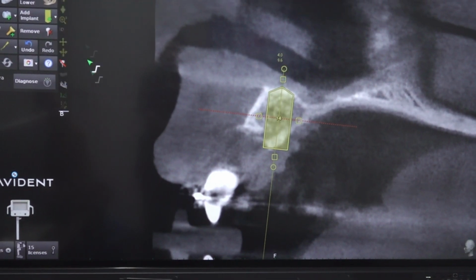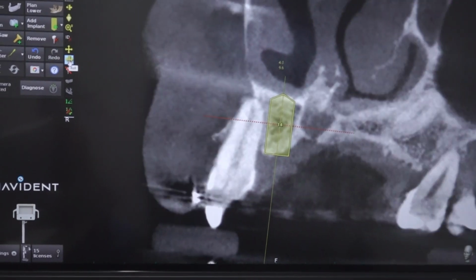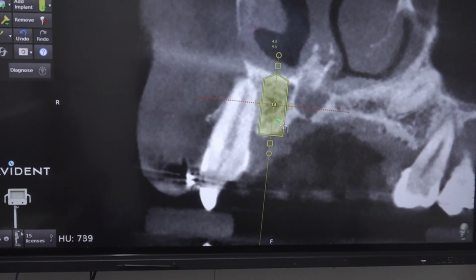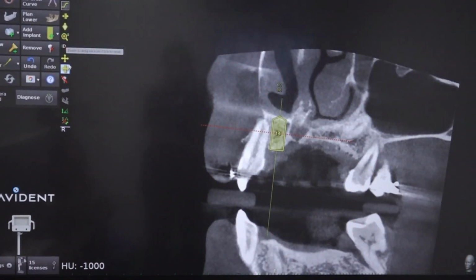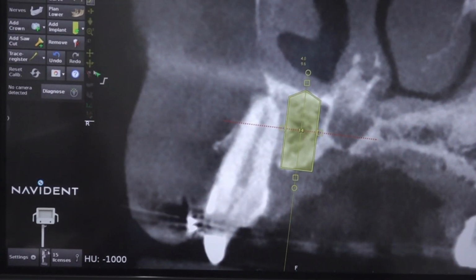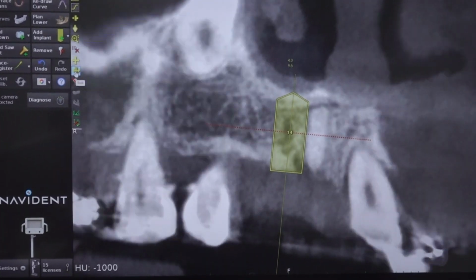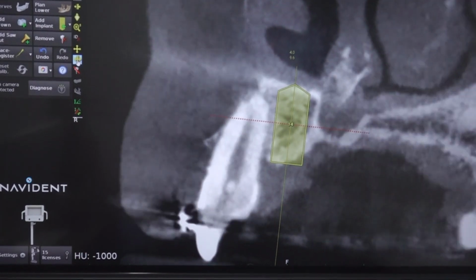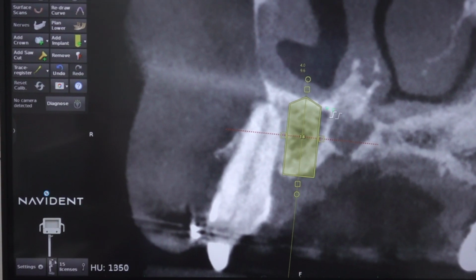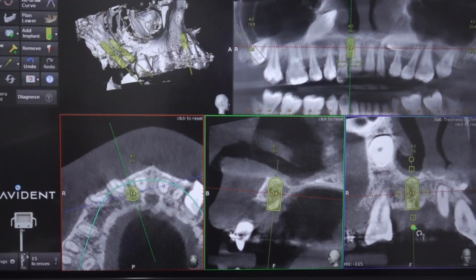Okay, let's see the 360 degree. Of course, if you see here, immediately the socket comes. Here the nasopalatal canal now comes. This is the central. This is canine. This is nasopalatal. Okay, this is one option.